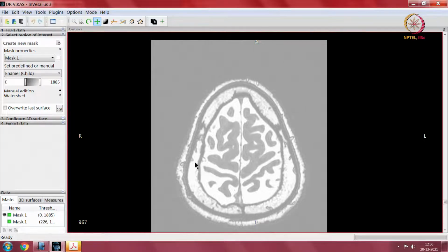Now, I told you that it may not be easy in everybody to identify all these structures. So, we need multiple markers of the central sulcus, and that is the purpose of showcasing this image. Now, what are the other markers of the central sulcus? The central sulcus is important, reiterating what I have already highlighted: it divides the brain into an anterior acting part, which is the motor part of the brain, versus a posterior part, which is the sensing part of the brain.